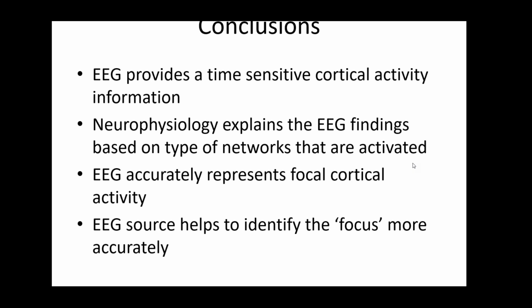I typically use the sLORETA at 90 to 95% of the solution. I don't really care about beyond that because you're interested in the highest concentration of dipoles. So those are the main key points to get a good sLORETA source from the scalp.